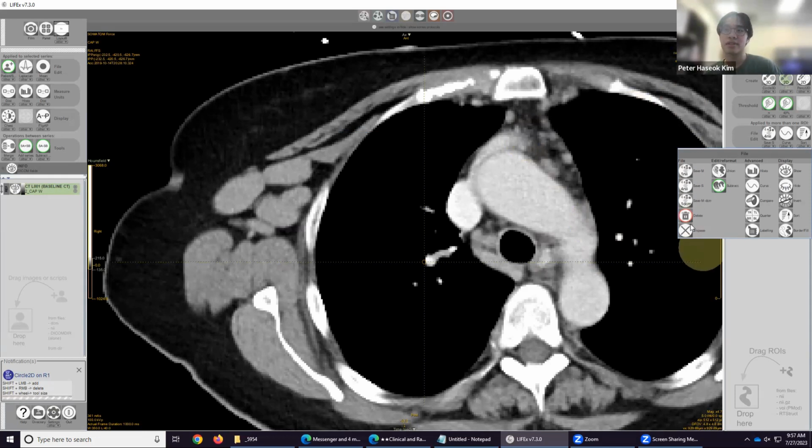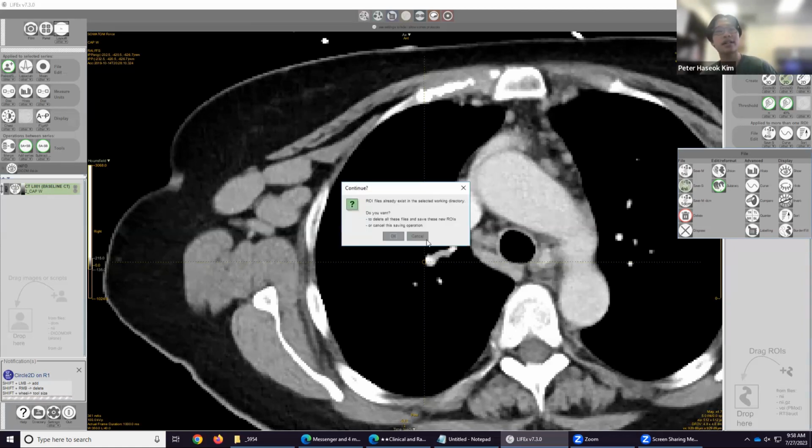If yours looks like mine, where it just has one option for save S, you're going to click save S. If yours has other options like save S16 or save S8, those numbers just mean what bit the image is saved in. We definitely want to save it into a 16-bit image, because 8-bit imaging only has around millions of colors, and 16-bit is trillions of colors, so way more quantitative data. And so you'll click Save As.